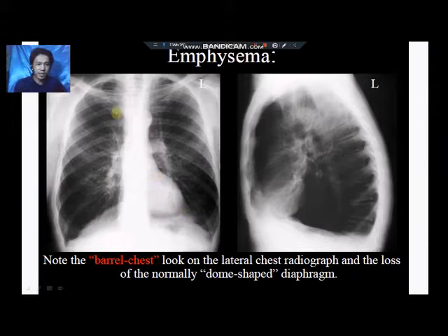If the lung fields of our patient were still normal, the color would be almost like this, all throughout the lungs. But because of hyperaeration, as you can observe, this portion of the lungs and also this portion look very black, very lucent compared to the rest of the lung fields. Okay, so this is the normal appearance.